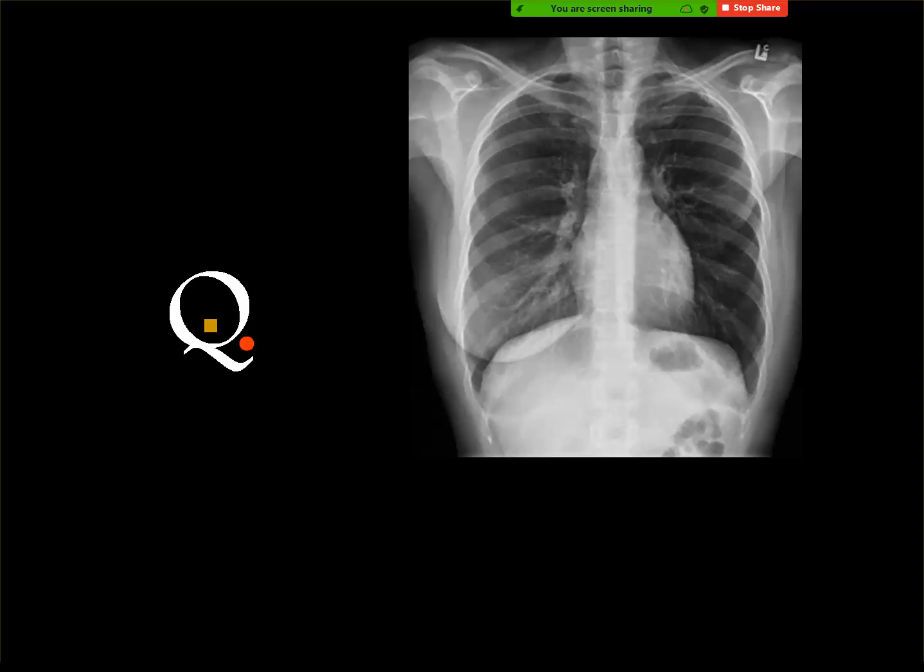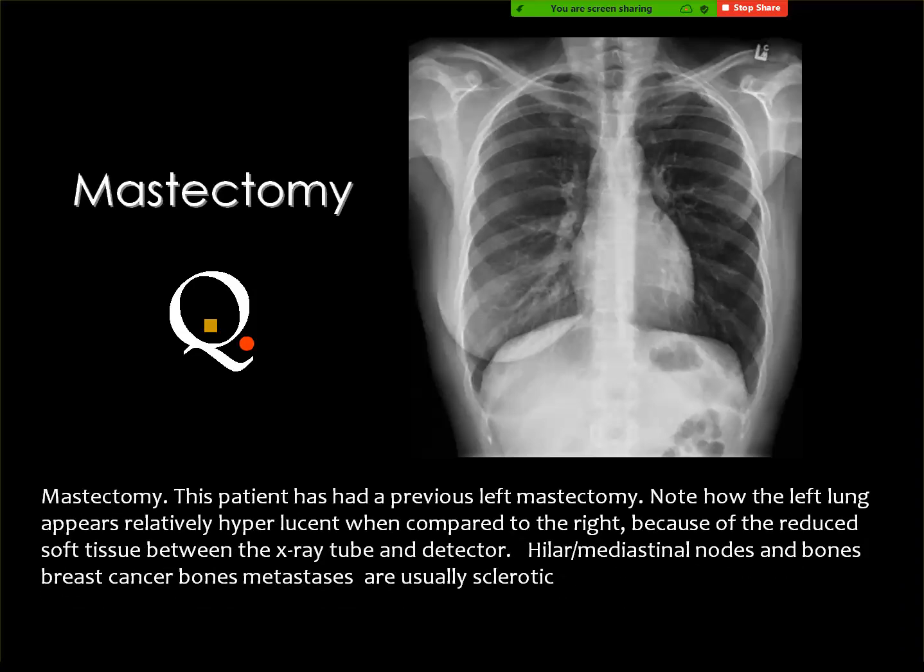This is Poland syndrome. No, there is no breast shadow on the left side. I gave you a note just a few seconds before. If you are interpreting a chest of a female, be careful about the breast shadow, especially in the exam. This is one of the famous tricks in the exam.